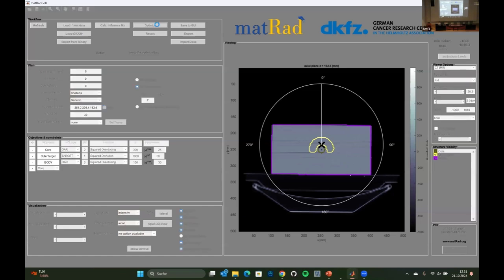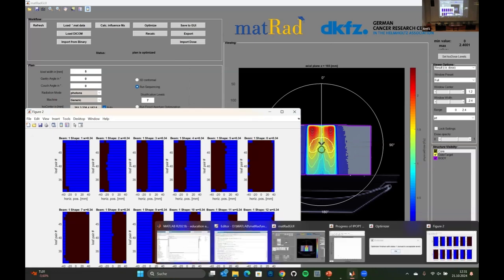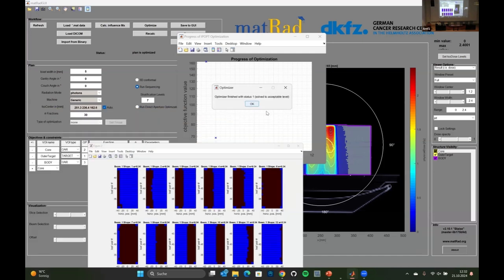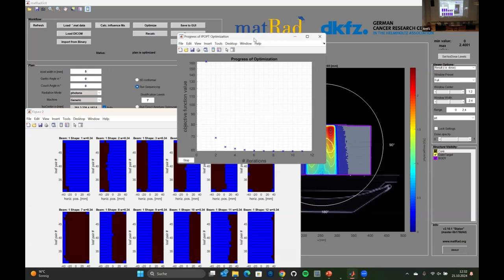Usually, this opens a window that minimizes a function, so you see what the algorithm actually does. It sometimes needs to wait a bit for the results, and a dialog might pop up in the background, depending on how large your screen is, that you need to click OK on.